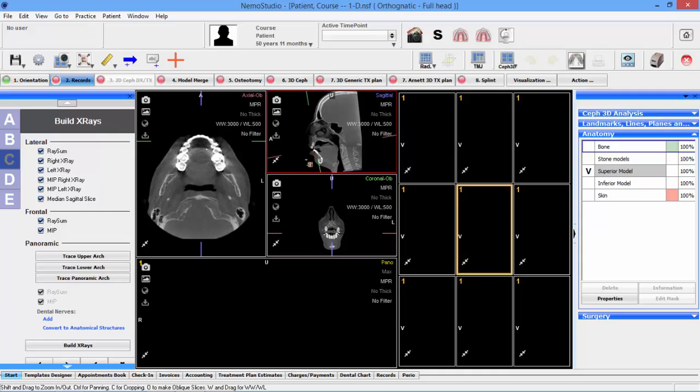So when you have a big protrusion in the mandible, do an inclined coronal plane to not have a big distance from the most anterior part of the menton to the most anterior part of the upper incisor. Okay, so try to get this distance as small as possible.